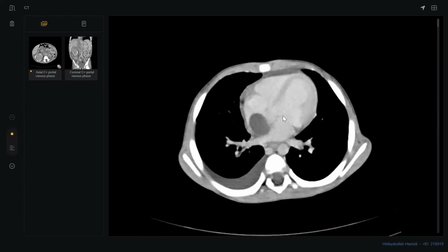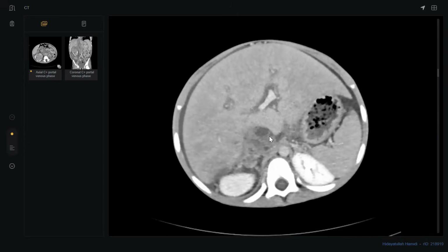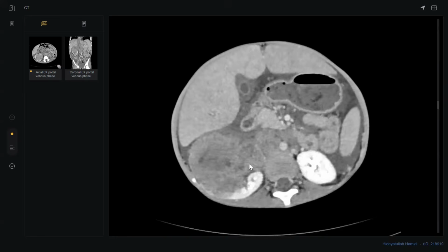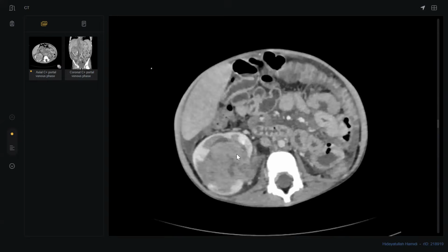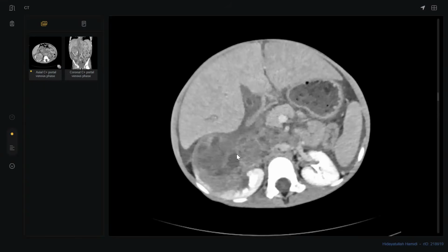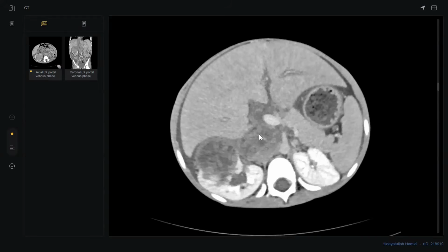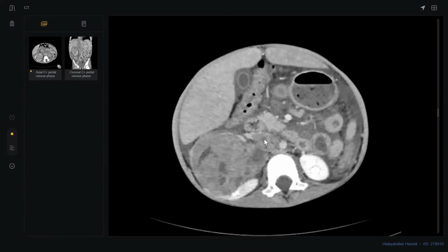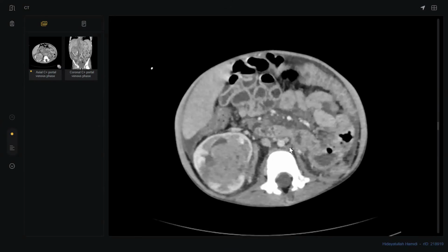The striking abnormality on this soft tissue window: there is thrombus extending up to the right atrium, coming down in the IVC and the likely right renal vein, and there is a large hypo-enhancing tumor filling the right renal sinus and destroying almost all of the renal pelvis, lower pole and interpolar region. No macroscopic fat or calcification in it.